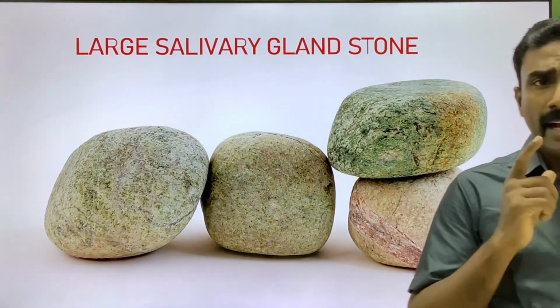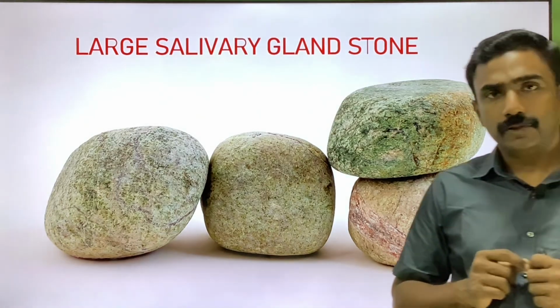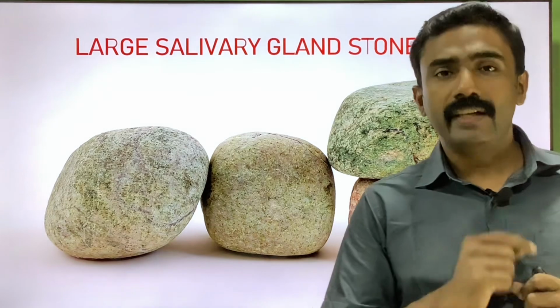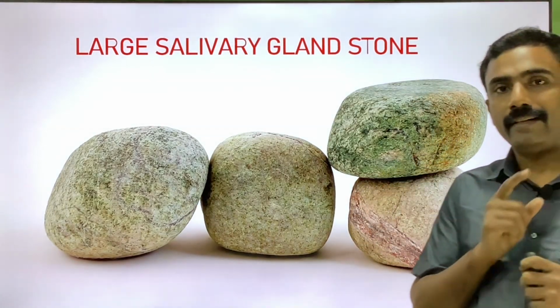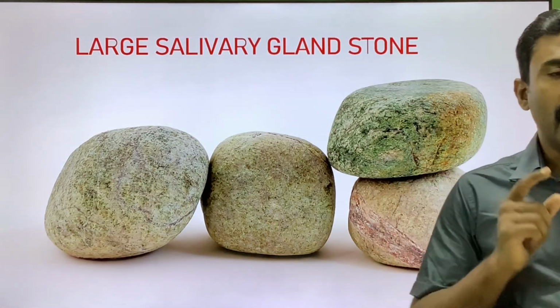So I will tell you the easiest way to diagnose a salivary gland stone. When you suspect a patient has a salivary gland stone, the first important imaging modality would be an orthopantomogram.